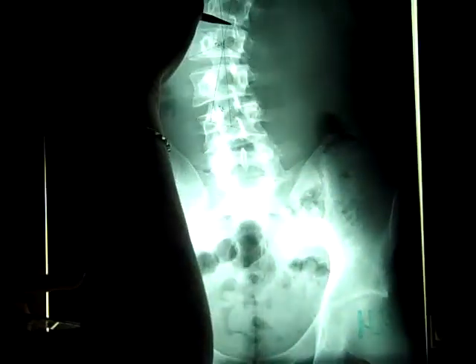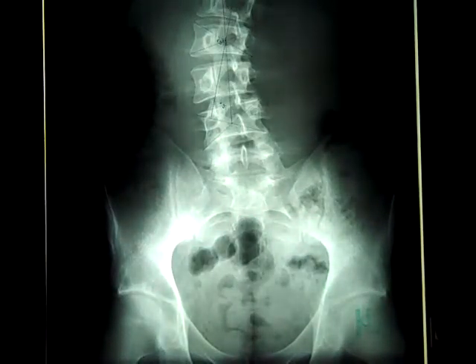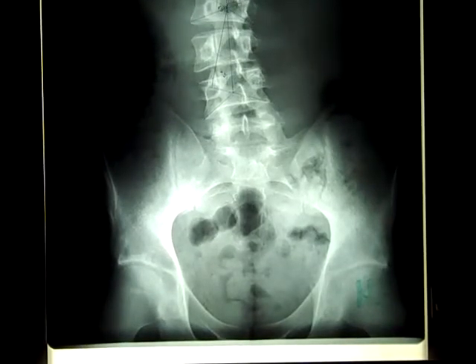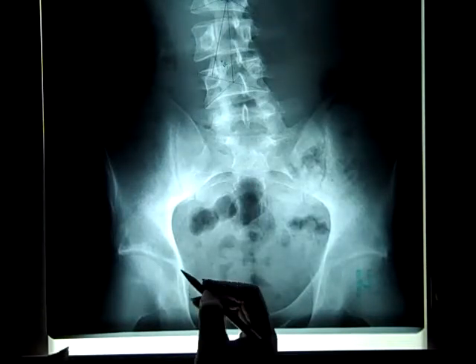and put up the next film, because the next one is called teardrop distance. Teardrop distance. And I believe that I'm going to have to angle the camera a little bit so that you can see where I am aiming, talking about. And for teardrop distance, I'm all the way down here at the bottom of the film.